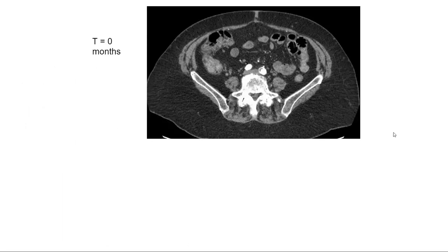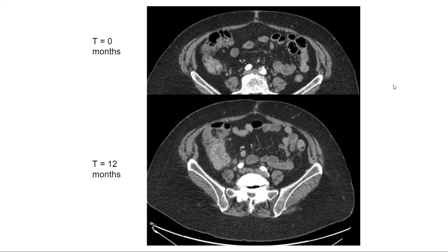Additional findings. So very briefly, these patients tend to not be the healthiest of bunches of patients, and unfortunately this is a case of someone who had a CT runoff in July of I think 2016, and then in 2017 came to see us for an intervention, reviewing the CT scan, and we saw this. And we looked back and we saw this, which neither was mentioned in the report, but it was identified during the day of intervention. Needless to say, the patient didn't have the intervention, had surgery first, and then had the intervention a few months later. But these patients tend to be sick, and tend to be not actively sick, but just older and prone to disease, so it's important to look at everything.